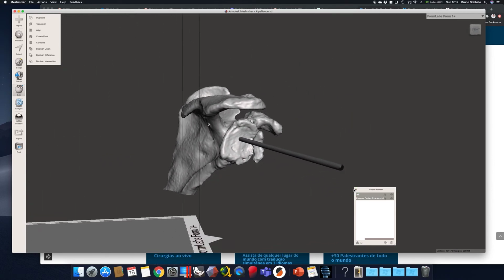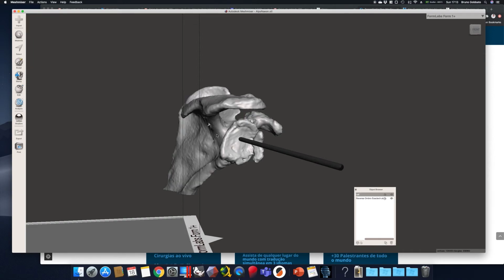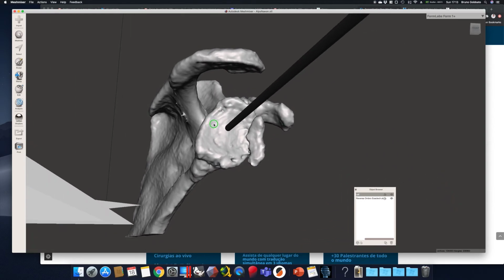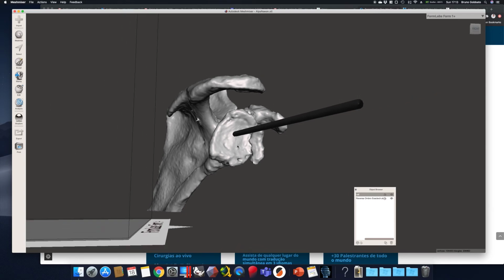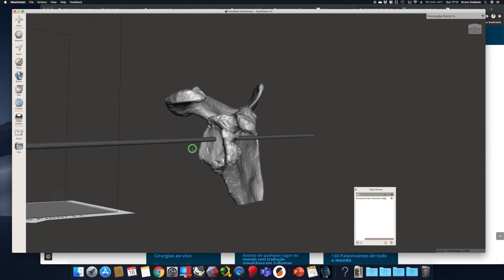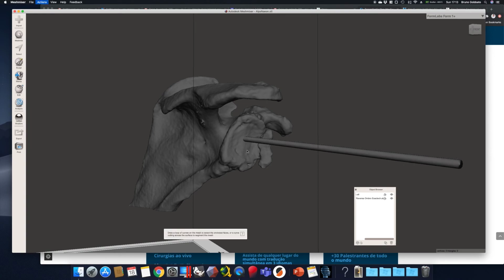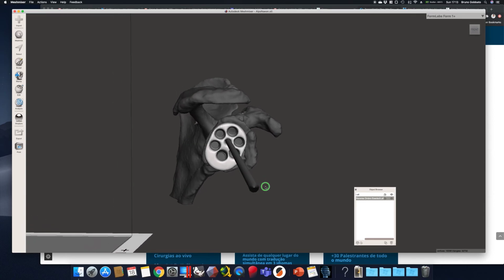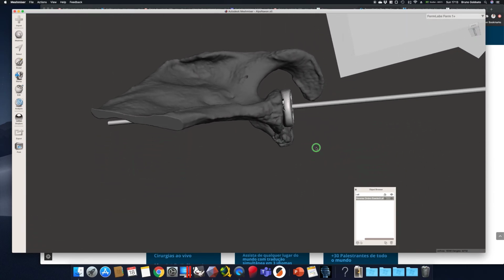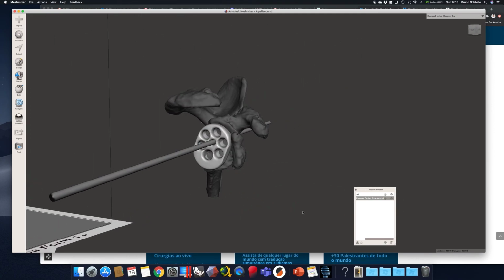If I want to create a patient-specific guide, I can create here in the software also a patient-specific guide. I can draw some simple solid over this glenoid and create a guide for this position. So this is a way how we can do our planning in a very simple and quick way. It's a basic planning, but can help us in a surgery or for someone that does not have the software available for the correct planning.